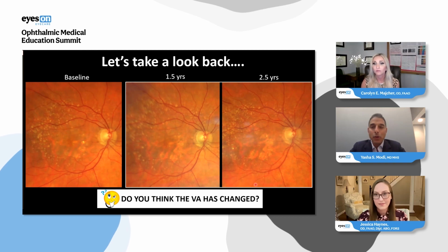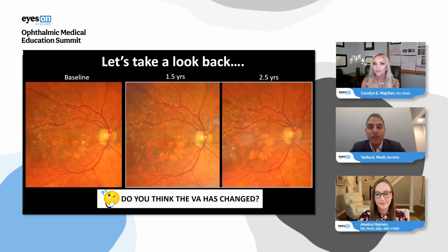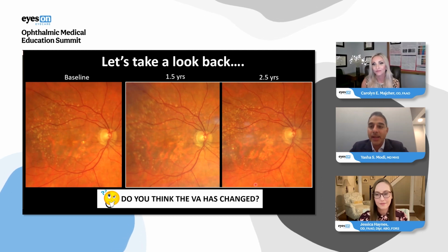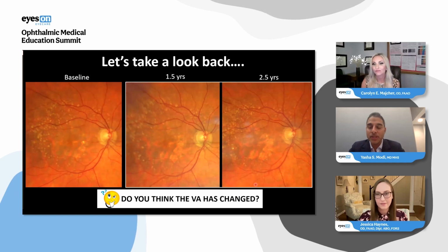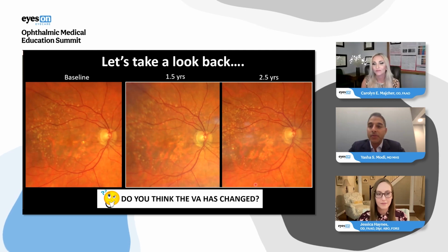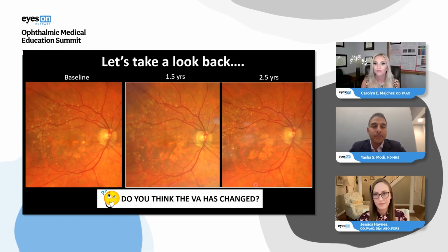This highlights so many of the shortcomings of fundus photos, right? Because if you look at this, you could say, well, maybe it has, but it's a game of real estate, right? And you can't tell what's happening at the fovea. Sometimes, using the OCT images, you had some on the cross-sectional image, well, the near infrared reflectance that accompanies the OCT image can provide you a lot of clarity in understanding the progression of geographic atrophy.